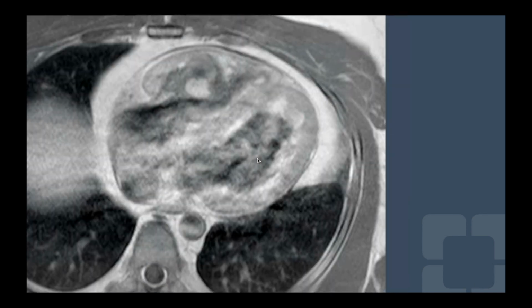But also let's think about the headaches and the numbness as well. So maybe something like TIAs. Is there a shunt, a PFO, or a source of emboli? If there's anything that can explain the symptoms, and then of course the CT prompted the MR, which makes us think, oh yeah, there is something going on in the heart.